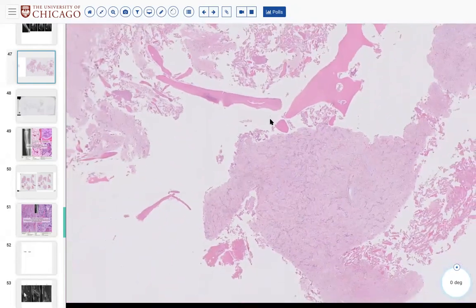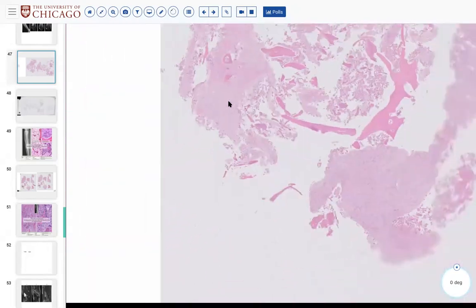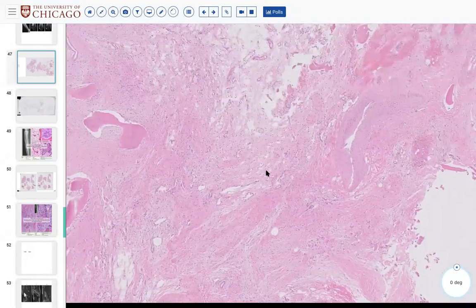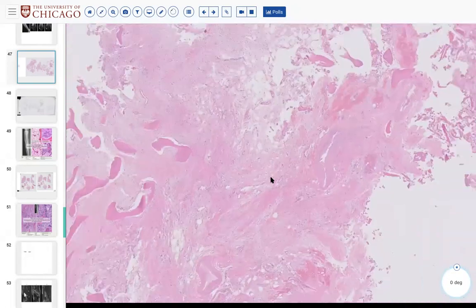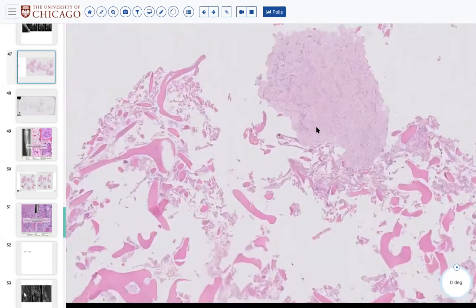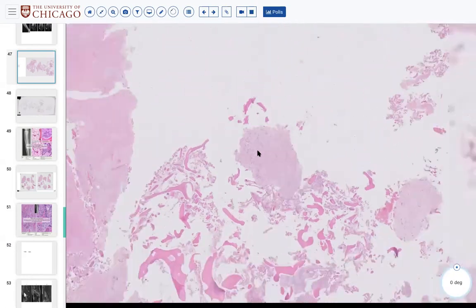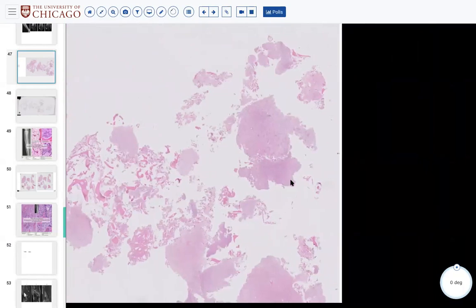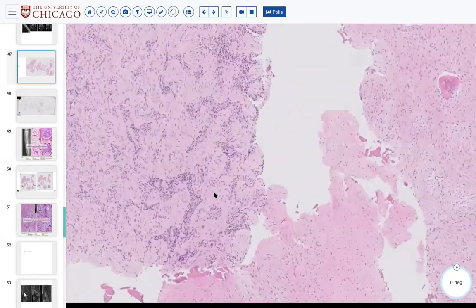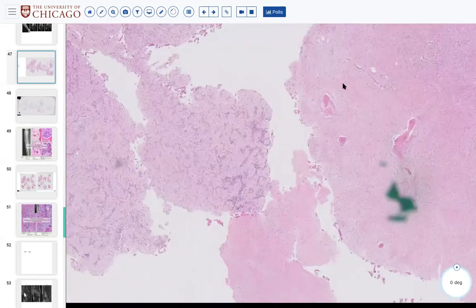Okay. So I believe those are myofibroblasts. So I would do some IHC to confirm. I'm thinking about something like a fibroma, desmoplastic fibroma, maybe. That's what I'm thinking, but I need IHC to confirm the nature of these spindle cells. Okay. Anybody else want to add any other findings? And then we'll discuss IHC.